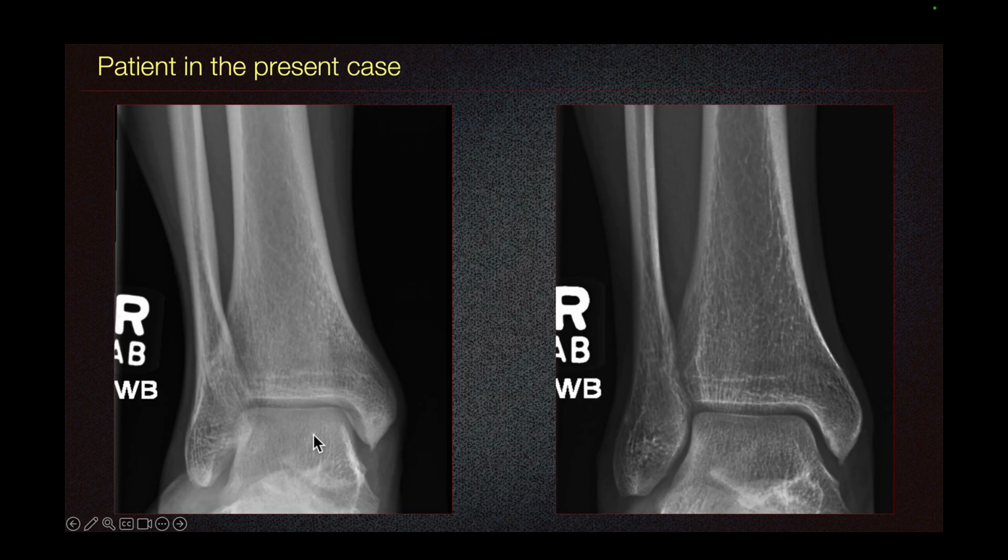So for the radiograph of our patient, we do not see any fracture, and we also do not see abnormal widening of the lateral clear space or abnormal widening of the tibiofibular clear space.